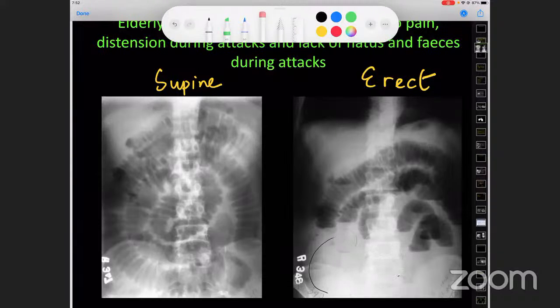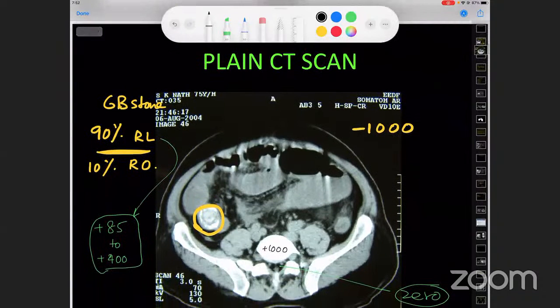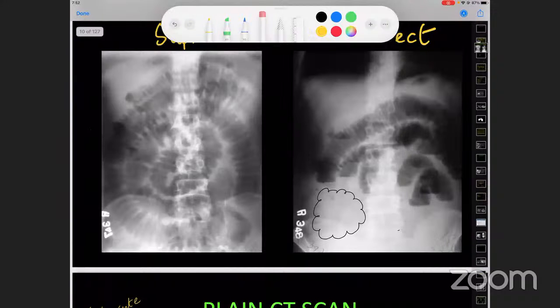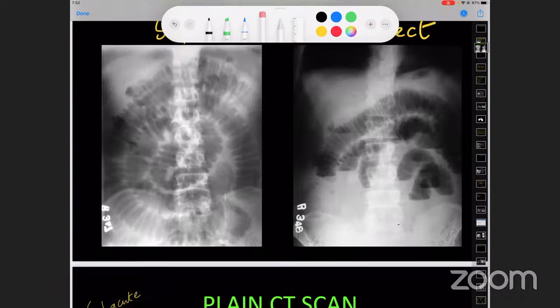With gallstone ileus, inevitably these patients present with subacute obstruction, which occurs and then relieves, isn't it? But I would have actually expected that stone to have shown up with one proviso. It might be lying on the right iliac bone, so it might have been hidden by the iliac bone. That is my concern. Something like an appendicolith that happens, we usually get it shadowed by the iliac bone. Okay, that was a good point.